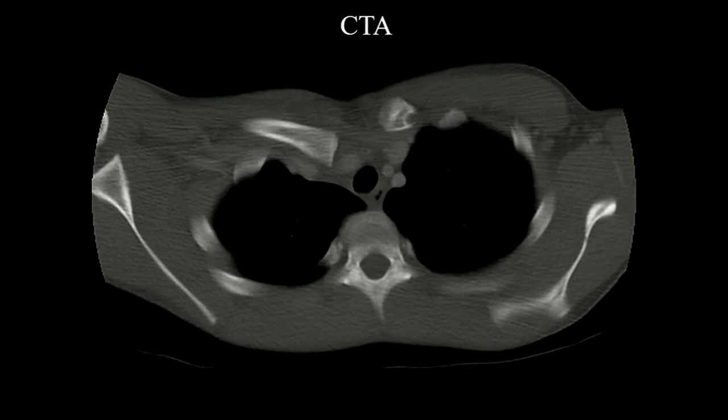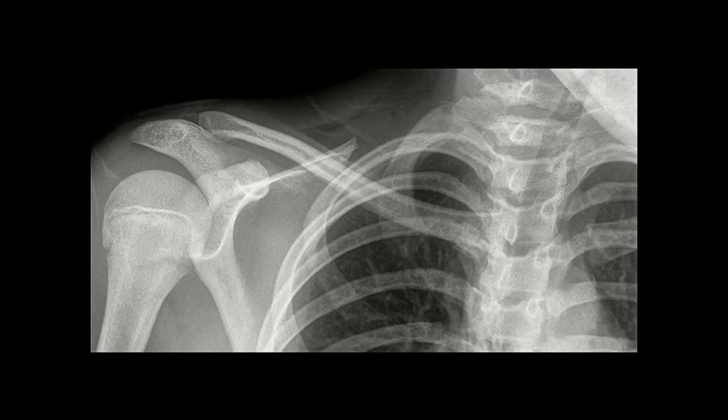So of course you're going to scroll through your serial imaging and figure that out, but I'll tell you this is the problem. This is posterior displacement, and you can just see with the vessels going posteriorly, knowing also the brachial plexus is going to be nearby some of these areas. You want to take a good look at the vascularity, make sure everything is patent, make sure there's no extravasation.